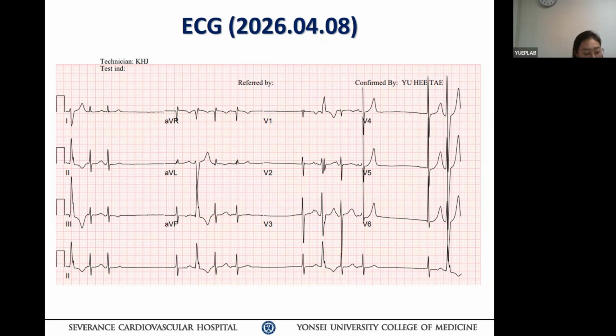Okay, Washim. So how do you think about this cardiac ballet? So, as Professor Park mentioned, there's a pattern in this ECG of 4 beats together with different morphologies of QRS. So let's go over each of these beats. If we look at lead 2, let's start from the third beat. The third beat has in lead 1 a normal looking P. So could you follow with the mouse? Yeah. No, you. Oh, okay.